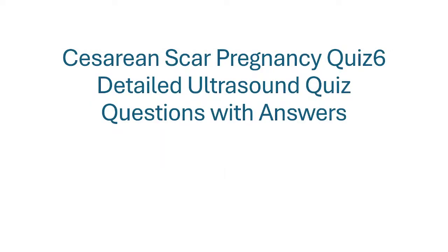Hello colleagues, how are you? Now we are going to do the cesarean scar pregnancy quiz. These are detailed ultrasound quiz questions. They are just 6 questions that I need us to attempt.